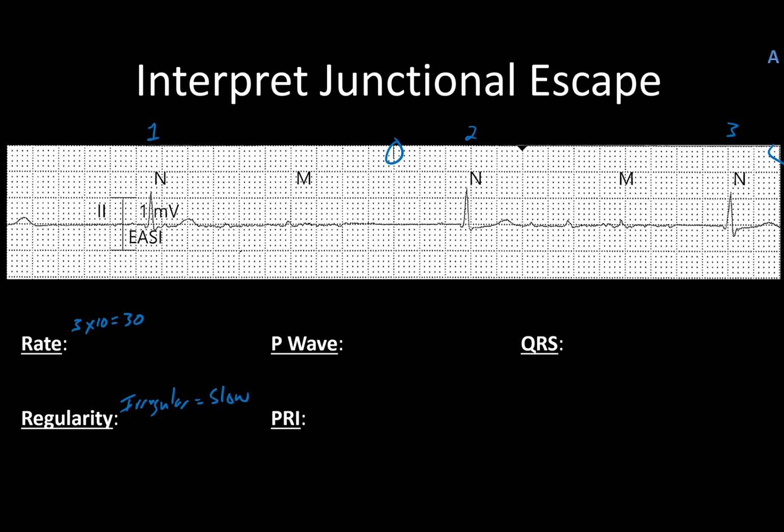Ultimately, we're looking for any patterns or how much alike each of those beats are and if they can be compared to one another. We will say that there's really no pattern that we know of. And there's no ectopic beats that we're truly aware of. We have some weird things here and here that we may need to take a look at, but we'll come back to those in a bit.